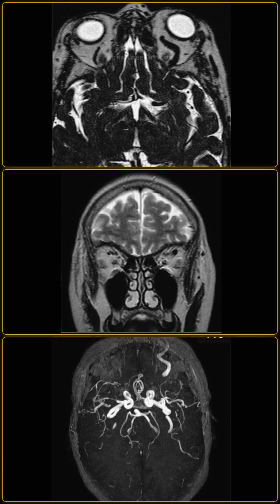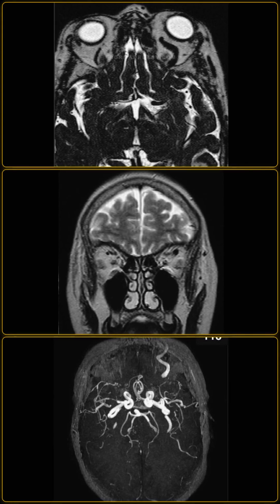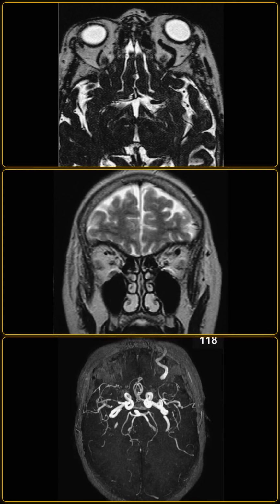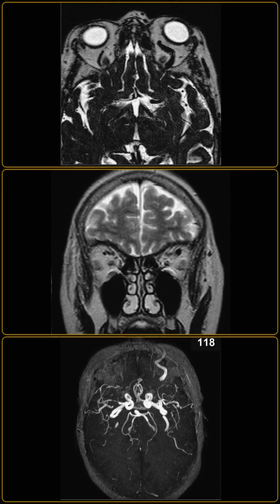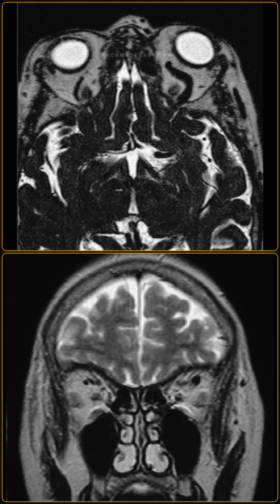The time of flight MR angiogram demonstrates normal major intracranial arterial anatomy. Crucially, there is early, high-intensity flow signal seen within the left superior ophthalmic vein on this angiographic sequence. I'm showing you a magnified view of the orbit.